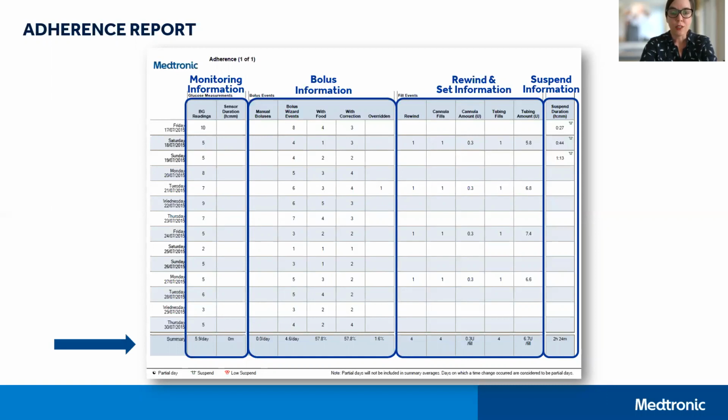Lastly, if this all seems a little bit overwhelming to begin with, you can actually just look across the bottom row for summary and averages of all of these event information pieces, and that would get you a good start with this report. So let's walk you through a live one.